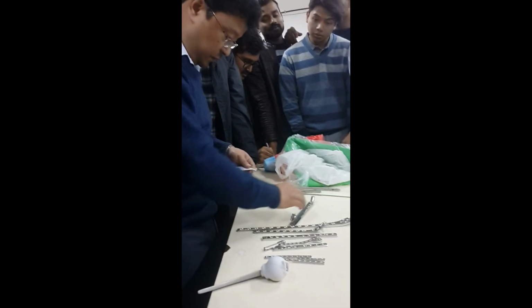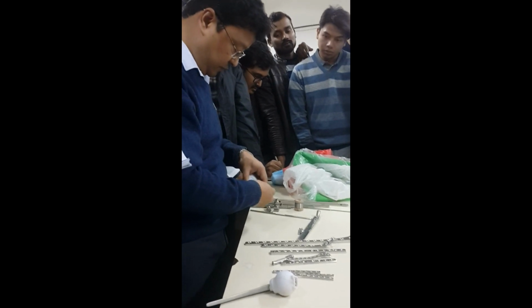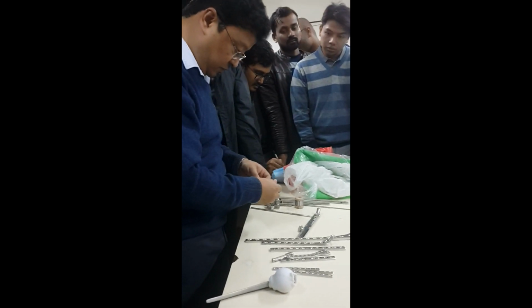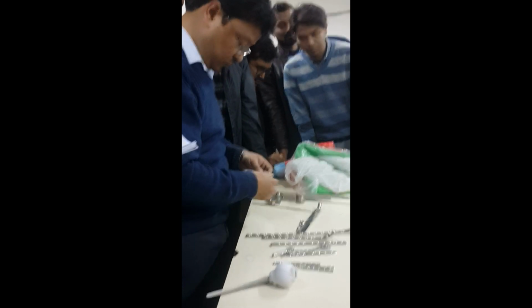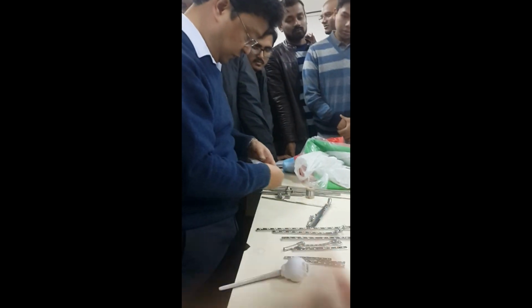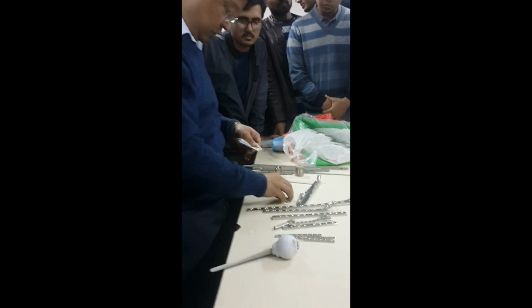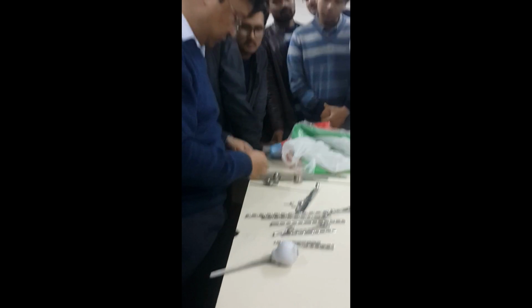Dynamic screw. Cortical screw. Cancellous screw. Lag screw. Pedicle screw.